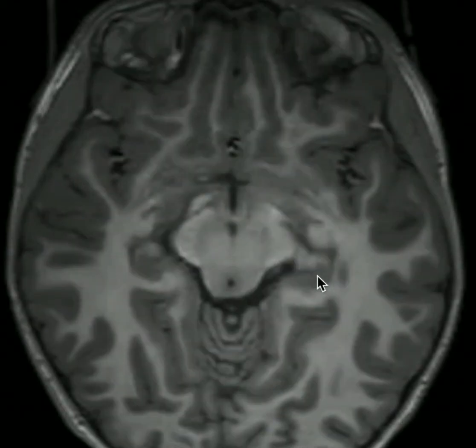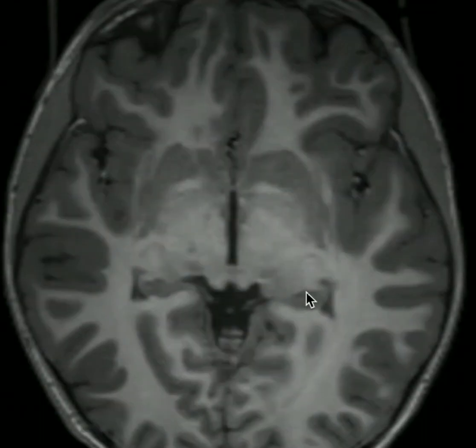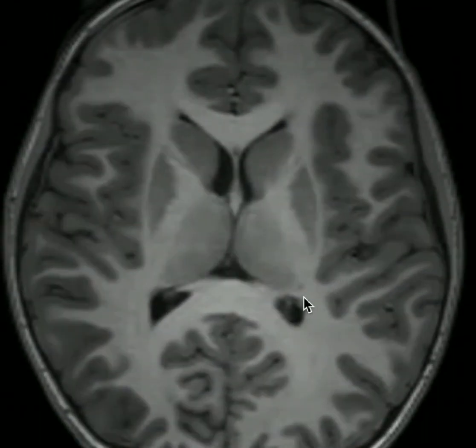If I go further up superiorly, I'll see the hippocampal tail, which begins at the level of the colliculi, or quadrigeminal cistern. A tapering strip of gray matter coming off the tail of the hippocampus can sometimes be identified as you scroll superiorly, known as the indusium griseum. It will go over dorsal to the splenium of the corpus callosum and is not very well seen in this particular patient. But here's the splenium of the corpus callosum that it would go above.